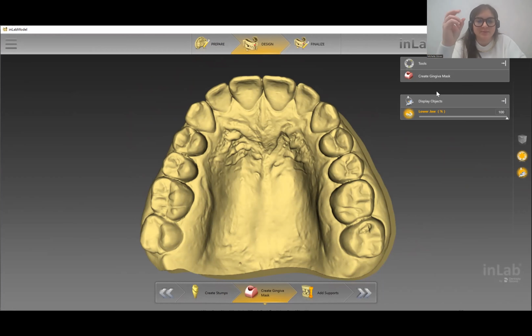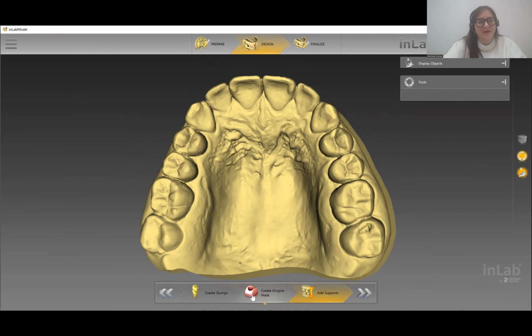And if you want to be able to really adapt your case for implant supported bars or an implant supported denture, it can be really key to create that removable piece if you need. But again, you can bypass any of those steps. It's not going to force you to take care of those.